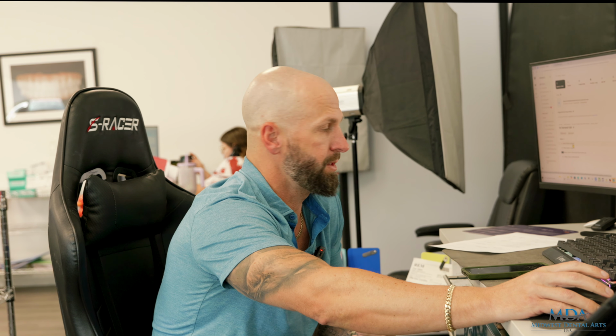One of our chairside technicians went in with a 3D printer, photogrammetry, and an intraoral scanner. When the surgeon and general dentist placed the implants, we went in, designed, and printed the teeth. So now the dentist just texted me and said, hey, everything's good. New soft tissue scans, new scans of the temporaries are uploaded. Go ahead and make the final design.